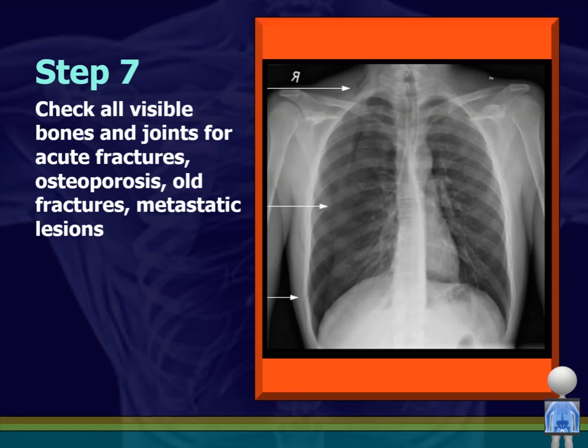What you have to be careful of is that you don't miss this type of fracture, this small little fracture here. And the way you do it is you follow the line, follow the line, follow the line. Just make sure you don't see a disruption in the outside of the bone. Now in this case, there is a small rib fracture. There's also a pneumothorax. If you guys want to look here, you see this faint line here, and it's darker here. This is the lung. This is air. And this is a pneumothorax caused by this rib fracture.